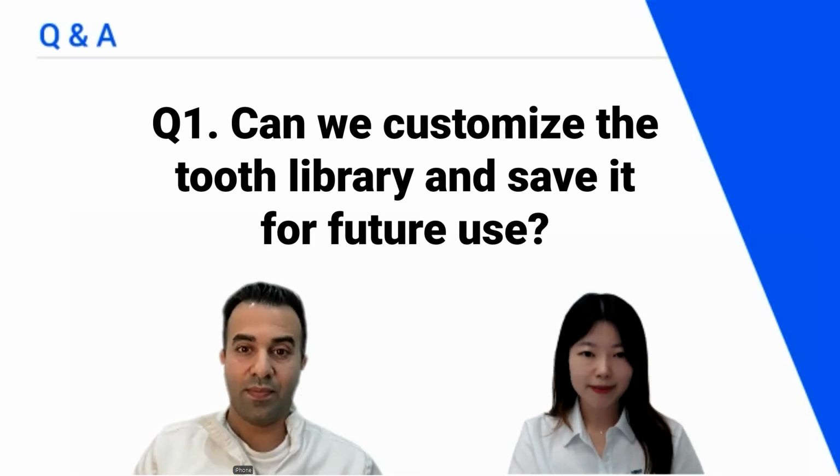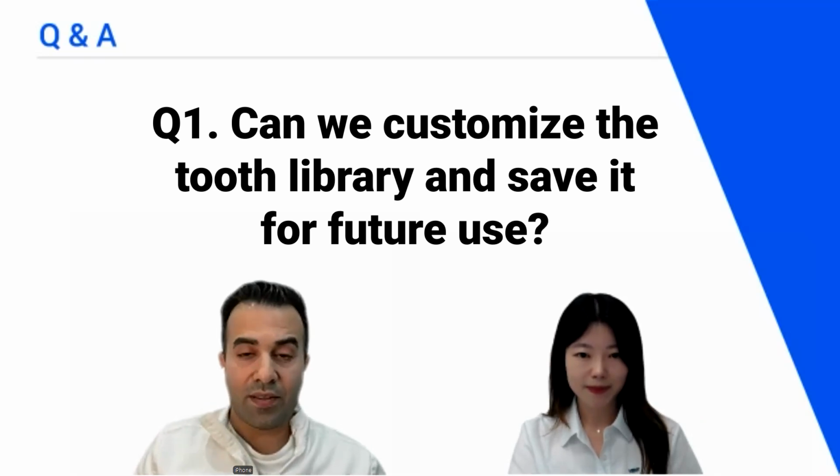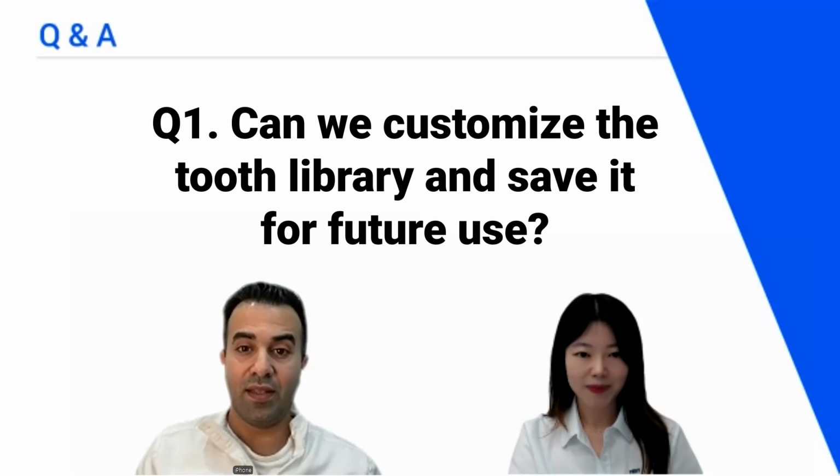Question number 1. Can we customize the tooth library and save it for future use? The answer is 100% yes, and that's what I've been doing. I have a 10-tooth library, from the second premolar to the second premolar, and technically, I have shaped it the way I like.